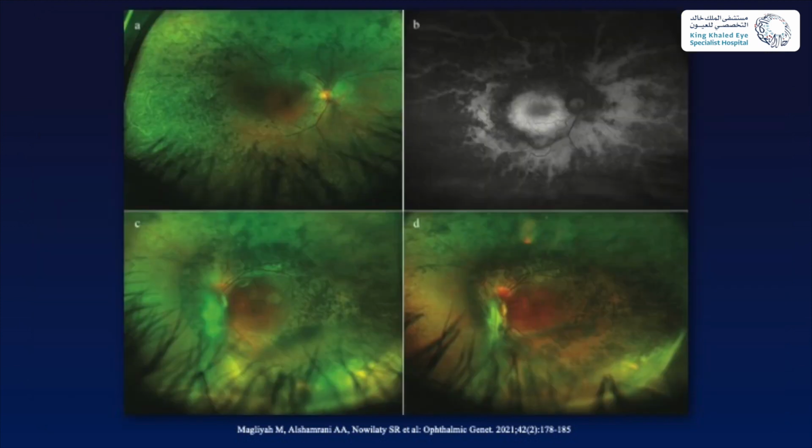This is a patient with a CRB1 mutation. You can see in the autofluorescence photo the typical preserved para-arteriolar retinal pigment epithelium. In the right eye of this patient, you can see the sheathed telangiectasia, which indicates inactive telangiectasis, and behind the lens, but not shown here in the photo, an area of active telangiectasia with red color.